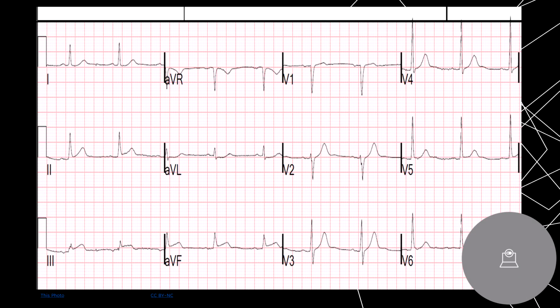All right, let's look at another one. Okay, we're going to speed this up a little bit here, guys, because I don't want this video to be an hour. Okay, V1 and V2. Cool. This is not inverted. Very impressive. Okay, so just to highlight your T wave, your T wave is right there.